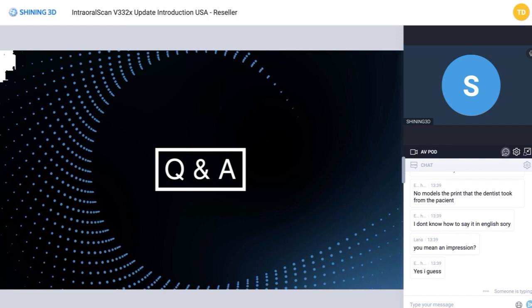Okay. So yes, you can also scan an impression. It would be the reverse though. We don't currently have an option to reverse the scan, like to flip it inside out, because when you're scanning an impression, you're scanning a negative. So currently we don't have an option to turn that into a positive model, but that is something that we will be developing in the future.